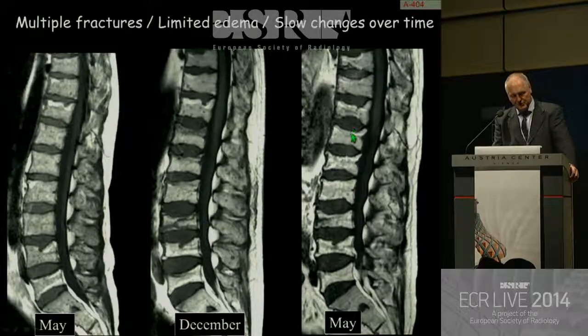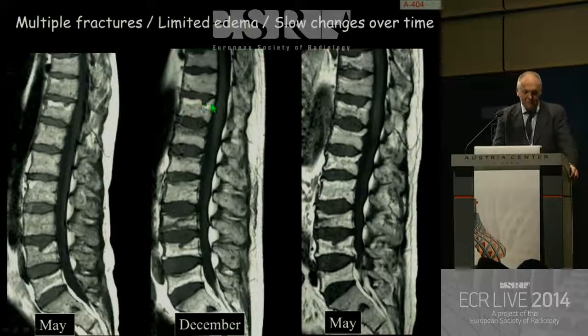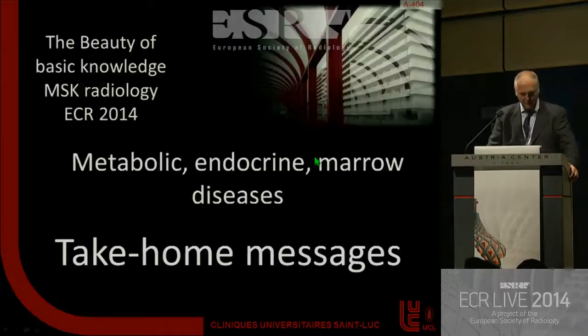And this is the same patient seen on multiple occasions on MR. You can see the development of the fracture and the persistence of the fracture line for more than 6 months, which is not acceptable in a normal patient. You have that bizarre appearance of Modic type 2 changes on one side of the joint. The disc is normal. There is no Modic change, no fatty accumulation on the other side. It's a unilateral problem which is related to the fracture and accumulation of fat within the callus.